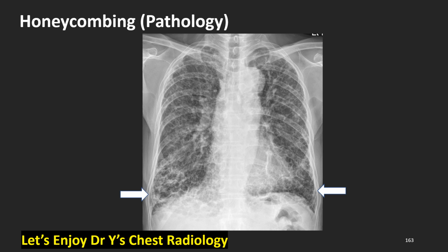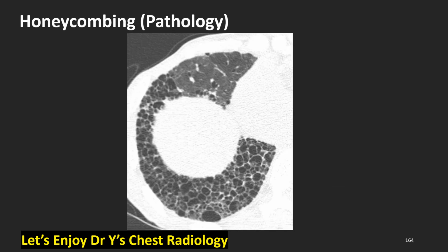Honeycombing pathology. Arrows indicate the honeycombing. Honeycombing pathology. We are watching the honeycombing in right lower lobe of IPF patients.